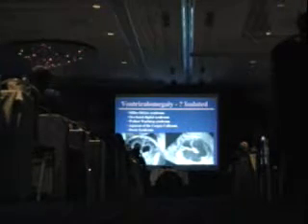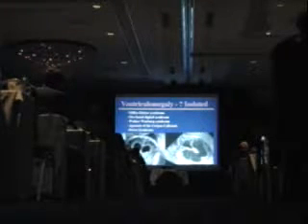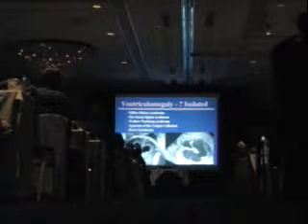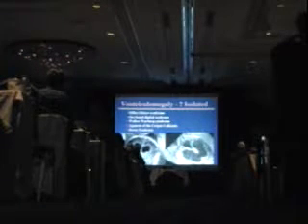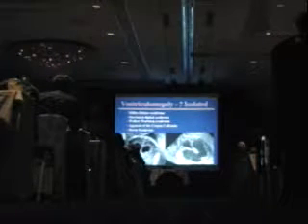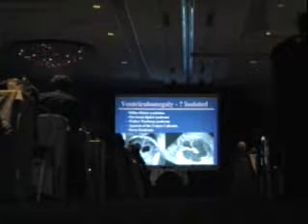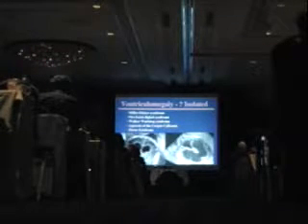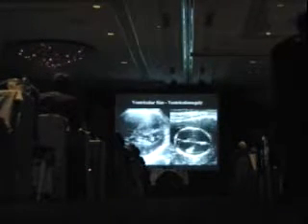Now, this one is not isolated. This one has a Dandy-Walker abnormality, and you can see the posterior fossa here. The cerebellar hemispheres are these little guys right here that are plastered up against the tent. And this is a large dilatation of the fourth ventricle that is filling the rest of the posterior fossa. This is very typical of Dandy-Walker abnormality.